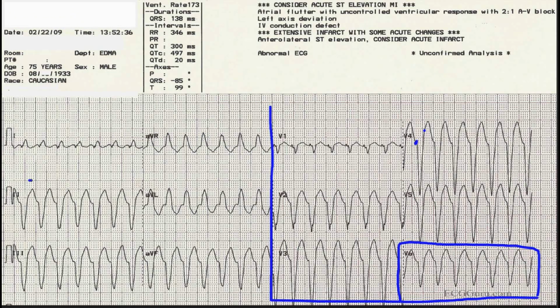So lead 2 would have a QRS that's upright and fairly tall and nice and positive looking. In this case, you see lead 2 is clearly negative. Not only lead 2, but lead 3 and AVF are also negative. 2, 3, and AVF all come from the left leg electrode. They're all looking up from the bottom of the patient, or from the floor up toward the heart.